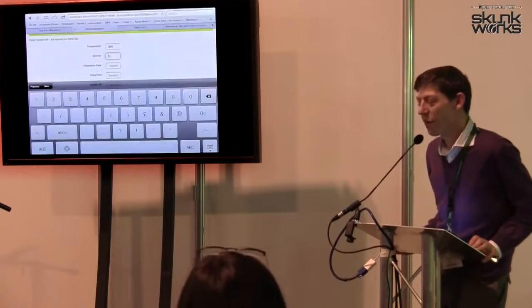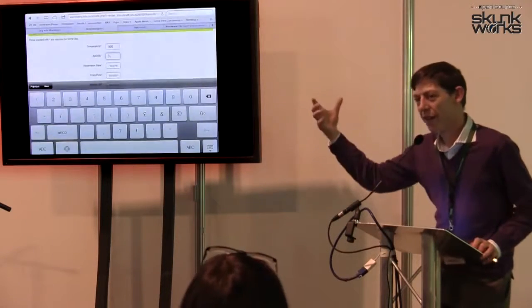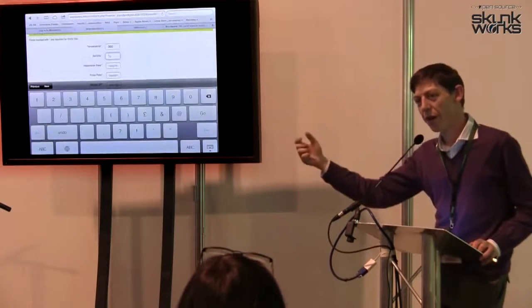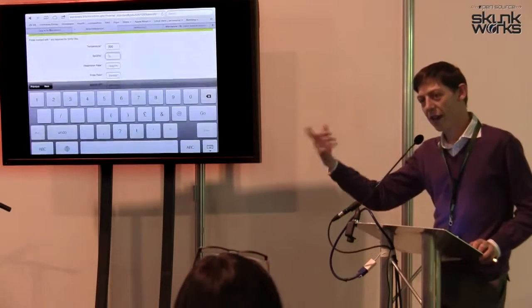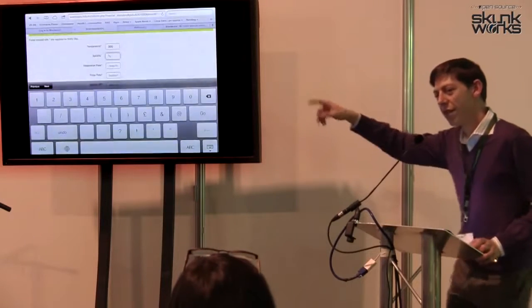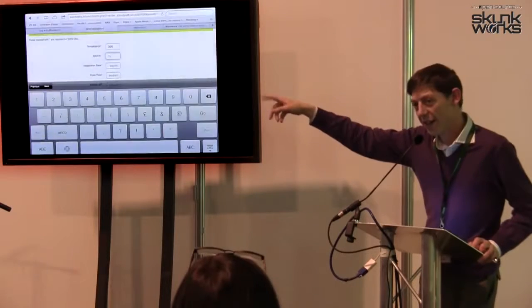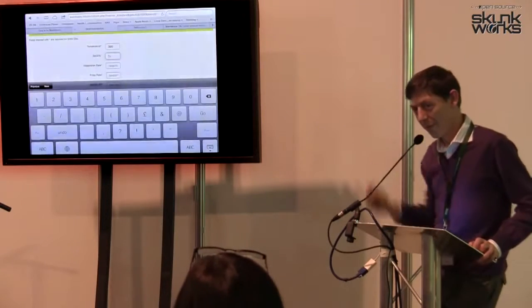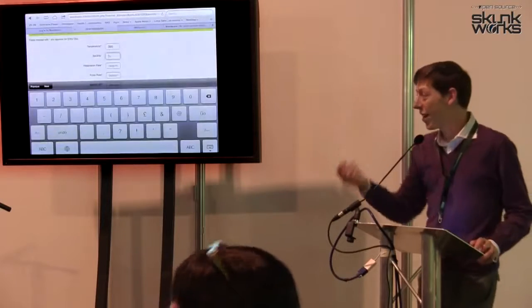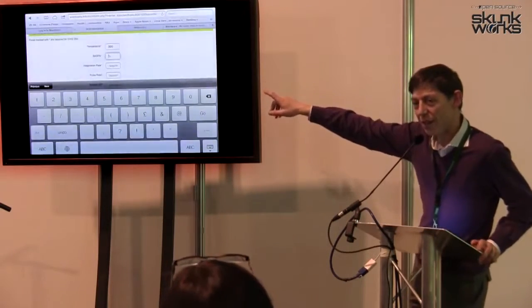One of the things that we discovered when we were developing this is that when you have a numeric input like this, the keypad doesn't display a decimal point. So in order to speed up the data entry for the nurse, we just put in the 3 figures like that. Because you're never going to have a temperature of 390, and the computer can insert the decimal point for us. But no, it's a good point. I mean, oxygenation.